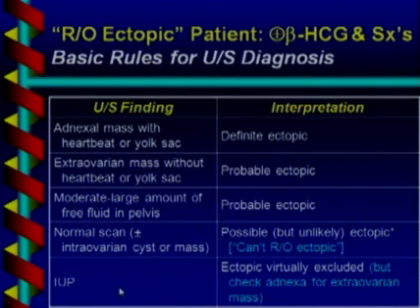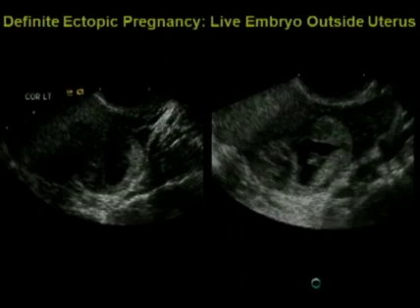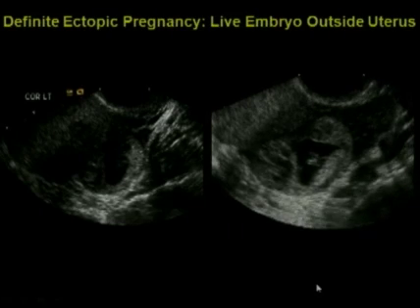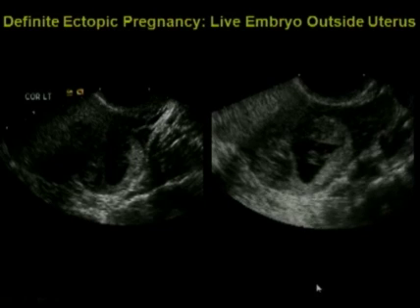And finally, if we see an intrauterine pregnancy, then ectopic pregnancy is virtually excluded. But we would still check the adnexa to see what we see. So here, the next several slides will be some ultrasound examples of these basic rules.